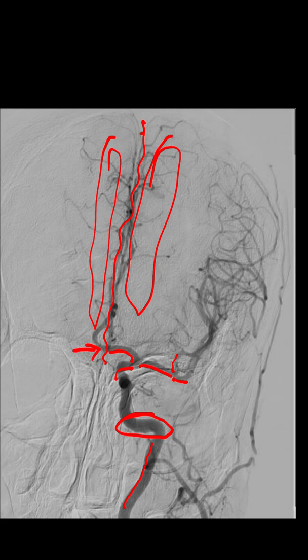Why understanding this is important is because, suppose 4 territories are supplied by one carotid artery, a stenosis is very, very significant. So it can vary. Imagine the carotid stenosis is on one side where this A1 is hypoplastic and the whole thing is supplied from the opposite side. This carotid is supplying only the middle cerebral artery territory, so the risk is much lower. For example, when it is supplying 3 territories, the chance of a hemodynamic stroke is very high.